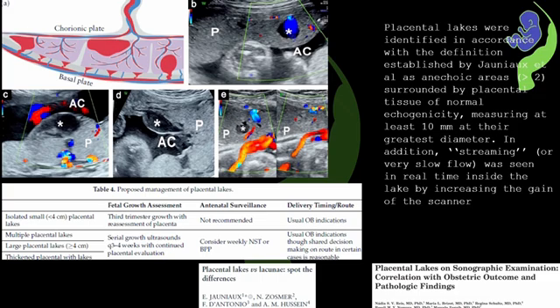On ultrasound, their appearance is quite characteristic. On grayscale imaging, they appear as anechoic and they are compressible when you apply gentle probe pressure. On color Doppler, you can appreciate low velocity swirling and/or turbulent flow within them.